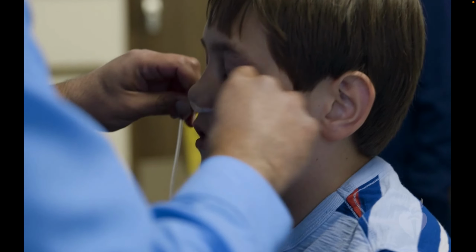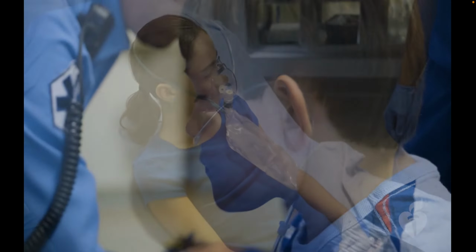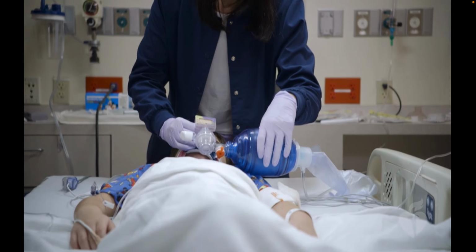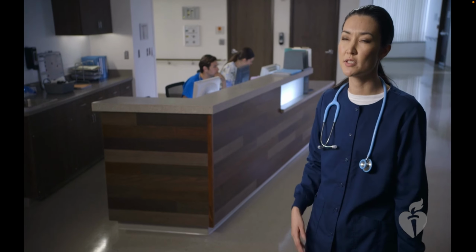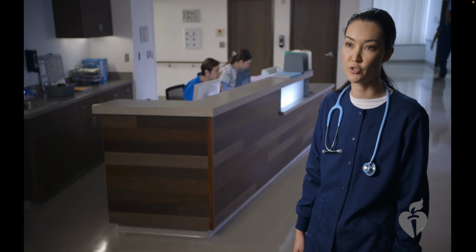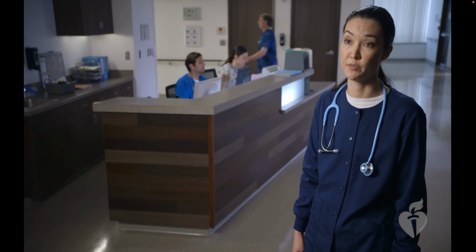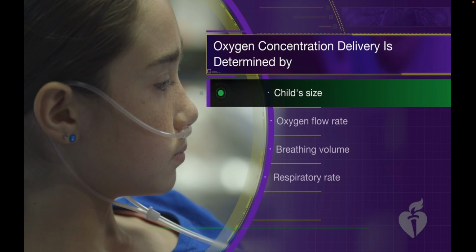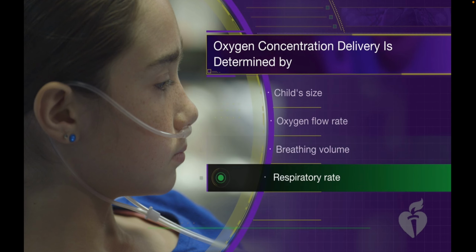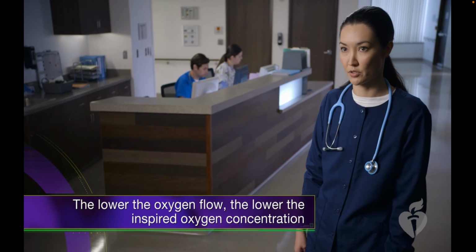You may choose to use several types of oxygen delivery devices, depending on the severity of the child's condition. Now, these devices vary in the oxygen flow rates used and delivered, and in the oxygen concentration delivered. You'll want to use low-flow oxygen systems when a child requires a relatively low inspired oxygen concentration and is relatively stable. These systems deliver oxygen mixed with room air during patient inspiration. The oxygen concentration delivered by these systems is determined by the oxygen flow rate, the child's breathing volume, and the child's respiratory rate. With low-flow systems, the lower the oxygen flow, the lower the inspired oxygen concentration.